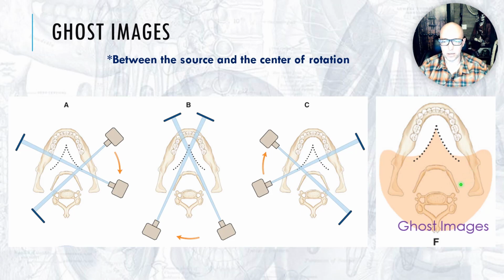Okay, so the posterior mandible, usually not the teeth though, right? In most cases, you're not going to see a ghost image of a teeth, but there are a few cases when you can. Where would a tooth have to be to create a ghost image? Really lingually inclined, very far posterior. And so we'll show you some examples of ghost images of teeth.